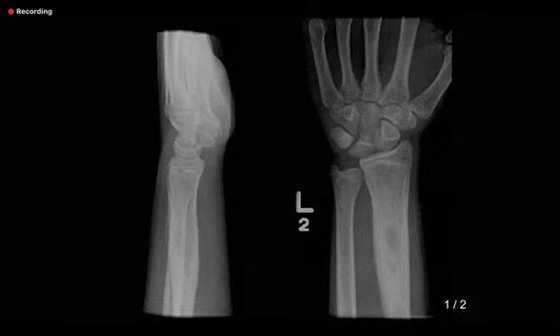It can happen in 10% of cases, but you have to tell what the reasons are on which you're thinking. The examiner is evaluating your thinking, and osseous matrix should be one of the pertinent negatives or positives to be able to differentiate between the two.